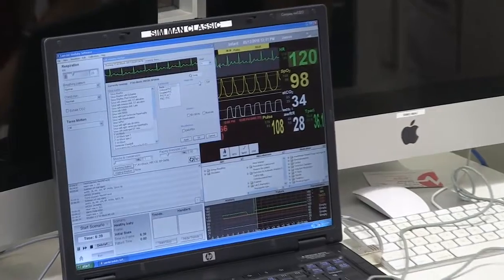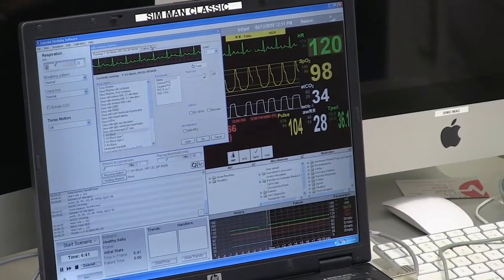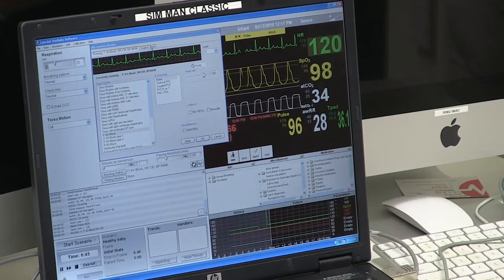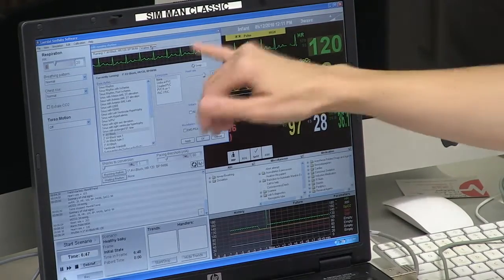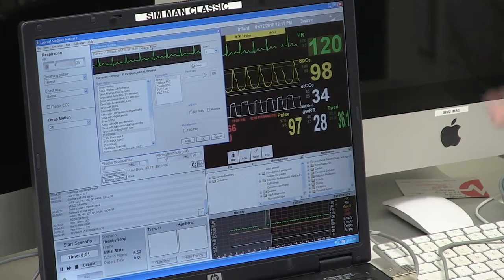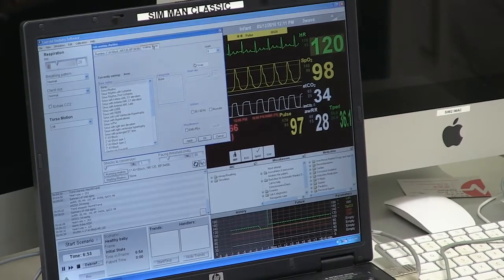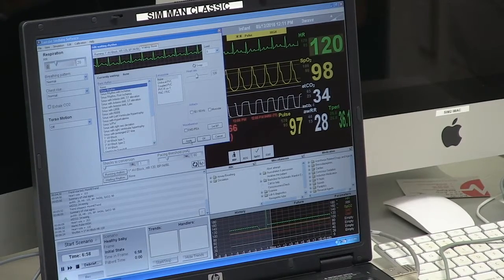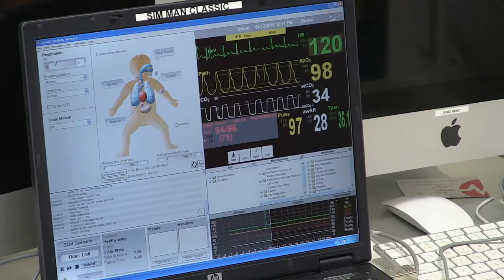The other thing that you can do is have what they call a running rhythm, so that's what you're in, and then if you quickly want to change on the fly or ad hoc to what's a waiting rhythm, you can have two rhythms that you bounce back and forth from pretty quickly. So you'd hit waiting rhythm and then click whatever rhythm you want. Again, make sure you hit apply and OK.